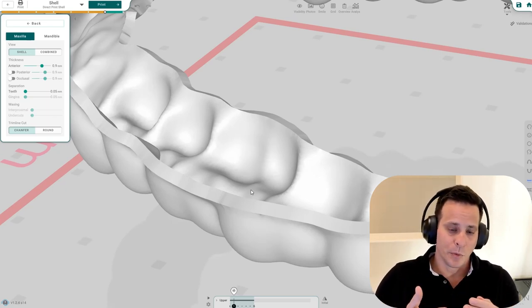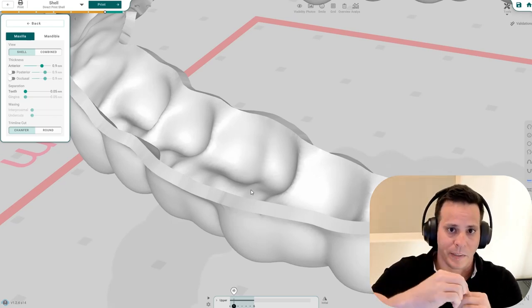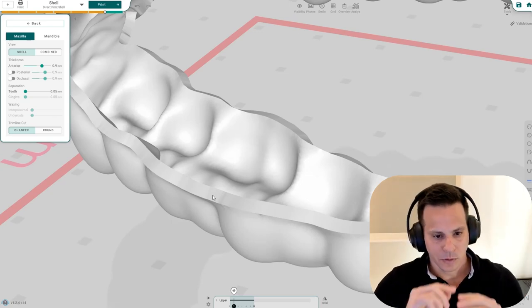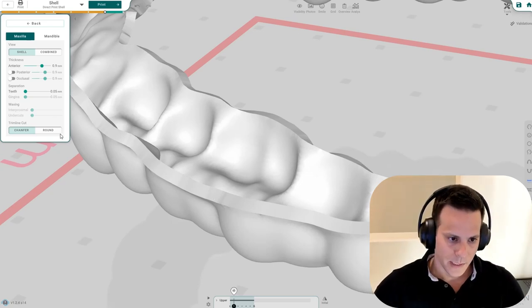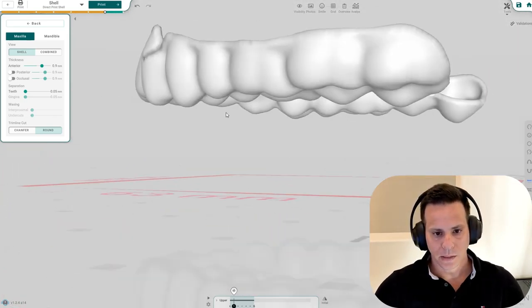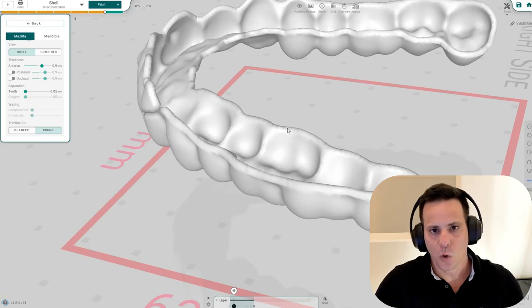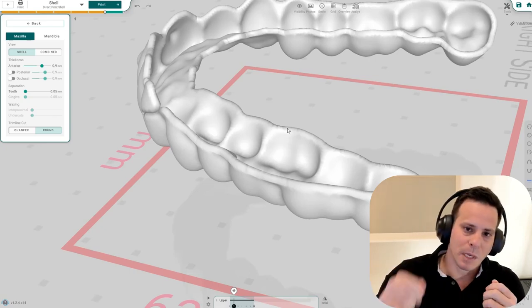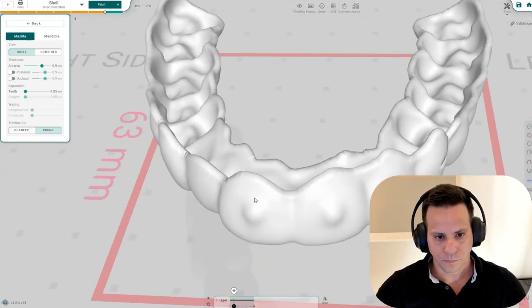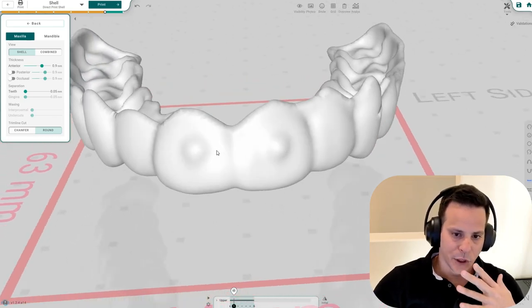Because if it's already smooth, you take it off and then you try to smooth it out, it's going to become very, very thin. So flat if you're going to do upside down with the supports on the surface, and round if you're going to put the supports here on the bottom, and you just want this to be already smooth. Maybe you will do a small polishing, but overall it's already smooth. But yes, these are the settings for the shell.